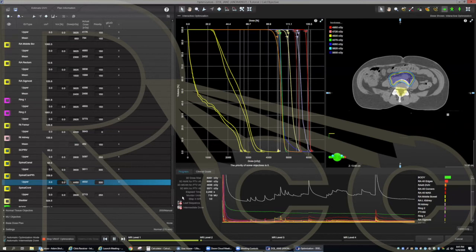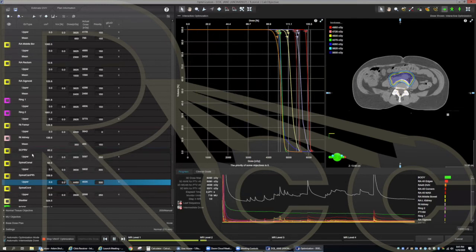And I'm going to pretty much just push this along to step 3 so that we can all see how I'll fine tune those PTVs. Pretty close to a clinical plan. Yeah, plus for most of your ORs, you're way low from the criteria, so just very good actually.